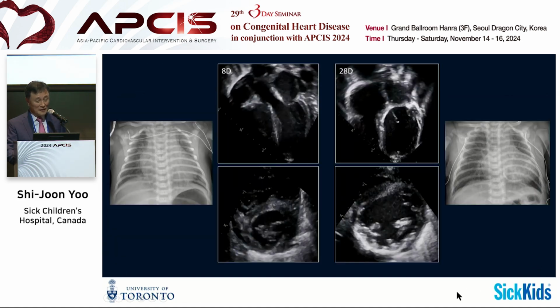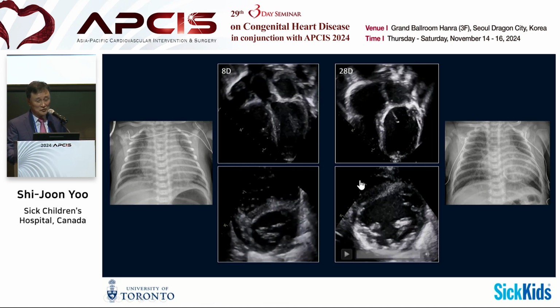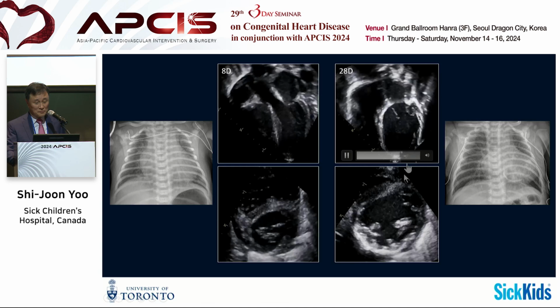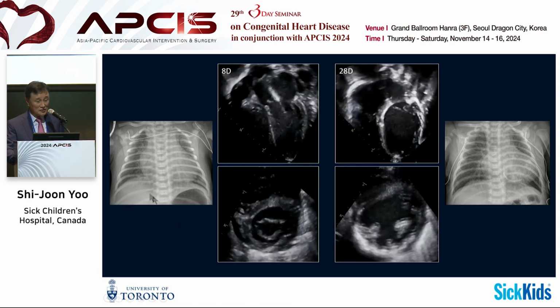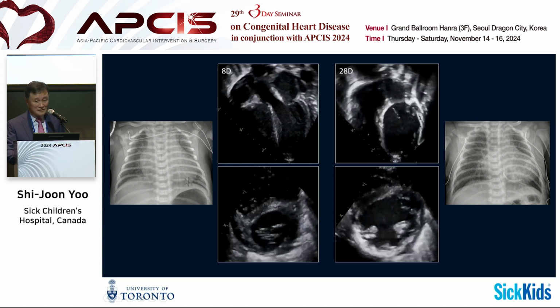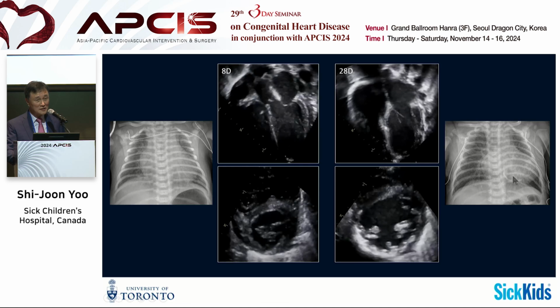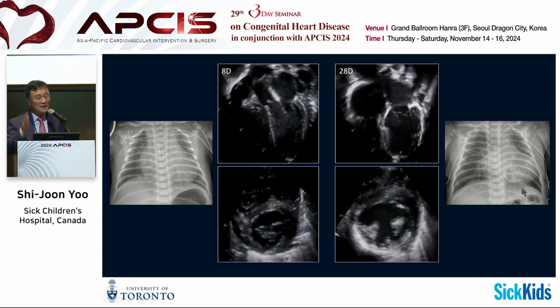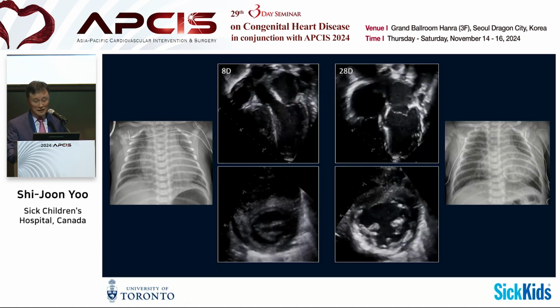At 8 days, the echocardiography shows no positive signs of calcification. However, at 28 days, you can see multiple spots of calcification here and there. This is the chest radiograph at 8 days, and this is at 28 days. You can clearly see calcification. I would suggest to you, if you see this finding, period, this is very classic of calcifying myocarditis.